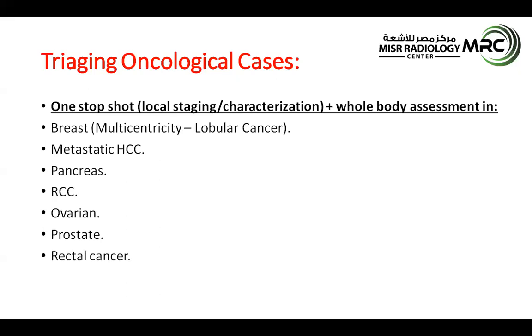There are also the rectal and colonic tumors, where we also know the importance of MRI in the local TNM staging, and the assessment of the perirectal fat planes and the mesorectal fascia, and assessment of the resection margins. In addition to the distant metastatic assessment based on the whole body coverage, together with the different metastatic musculoskeletal malignancies.